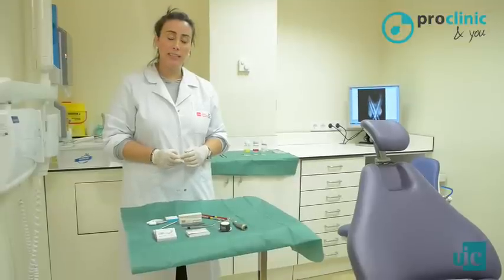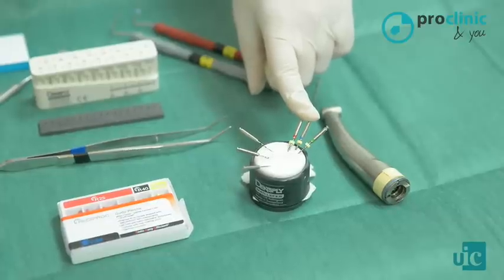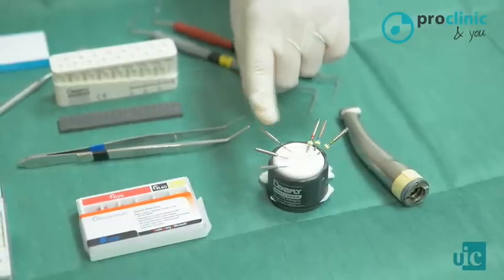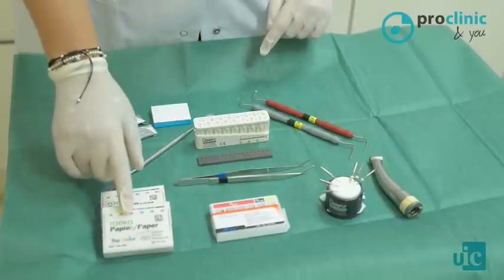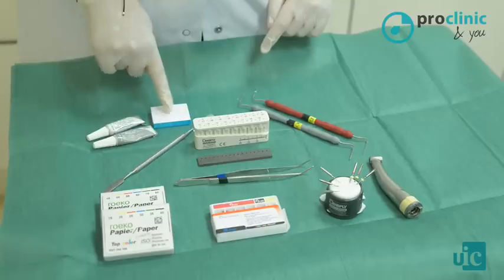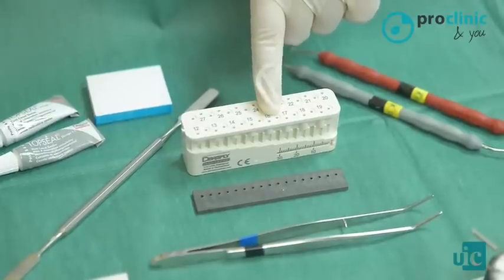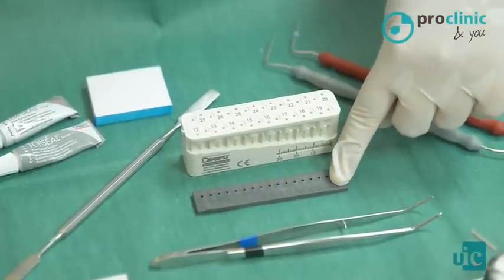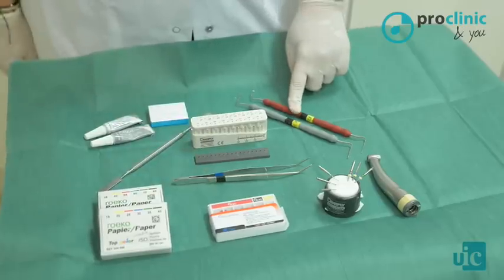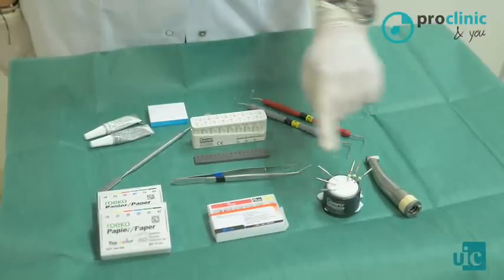To fill each of the root canals, we need, first of all, files to gauge the canal. They are going to be files of less taper, but similar caliber as the master file. We also need a gutta percha condenser, absorbent paper points to dry the canal, sealer, a spatula and a paper pad to mix the sealer, a ruler to determine the length of the canal, a calibrating ruler for the gutta percha points, tweezers to take the gutta percha points to the canal, gutta percha pluggers, and finally a contra angle to use with the gutta percha condenser.